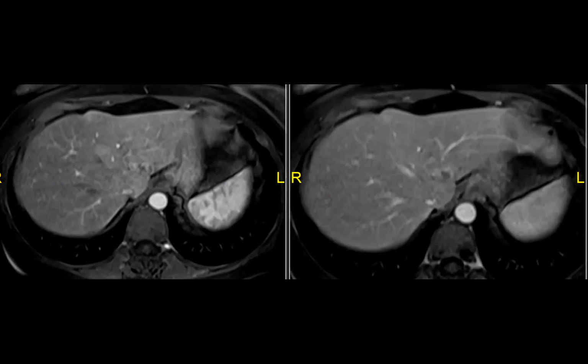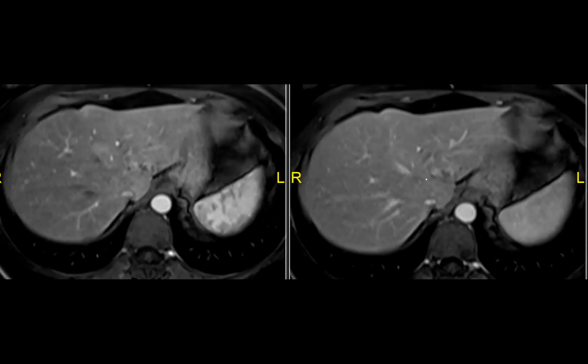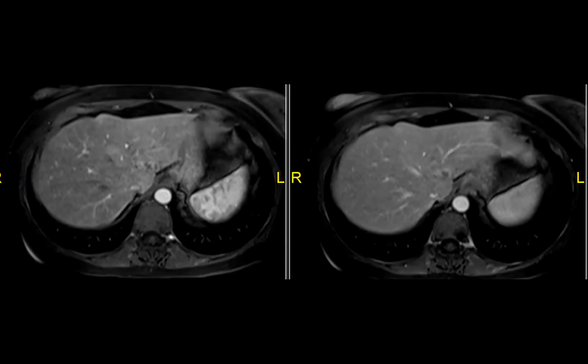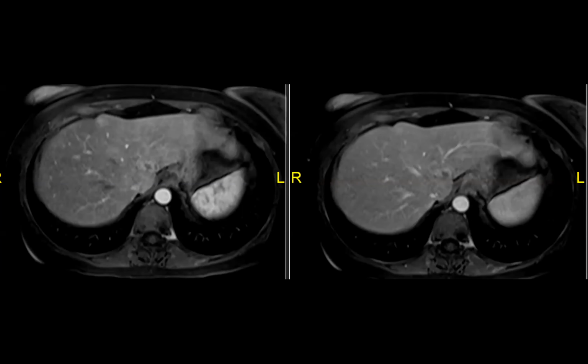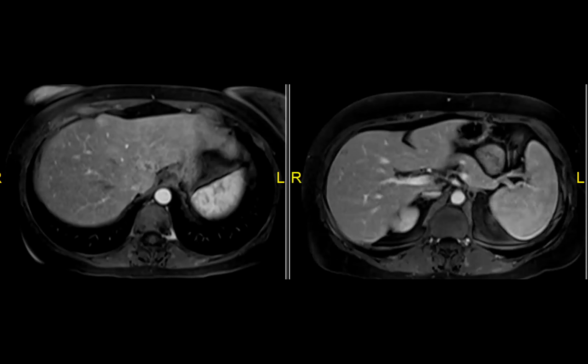I wanted to say hemangioma, but I think that would be too easy. Patient doesn't have a history of like mucinous adenocarcinoma and such. So I actually don't remember, this is an outside study. He came already with a diagnosis, but this I would caution. All of these lesions were read as consistent with hemangiomas, but I would be very cautious.